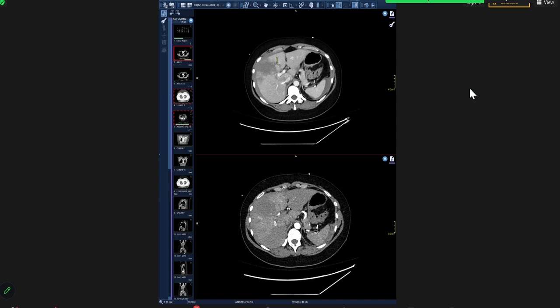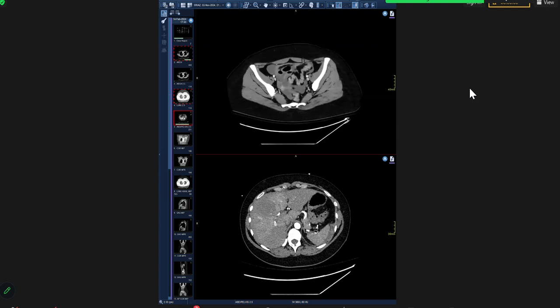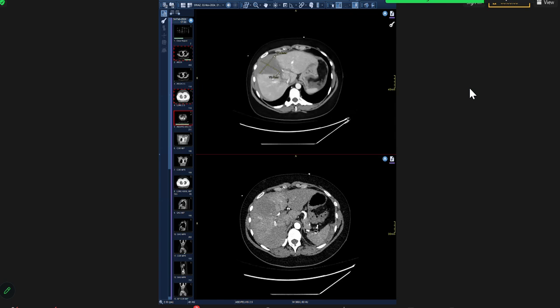This is the vein and this is the artery. So there was a contrast extravasation here because you see the vessel here, and this patient was actively bleeding, like they were pumping blood into him, and his blood pressure would drop. He was very, very unstable. You can see from the degree of hemoperitoneum. This scan was acquired in minutes, but the patient kept getting sicker and sicker. So when we suggested that we bring the patient back and do an arterial study, they said it's not possible.